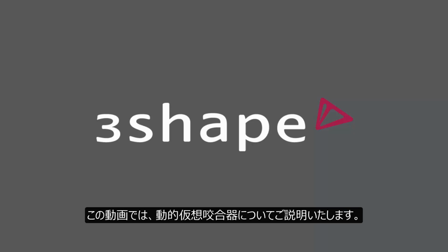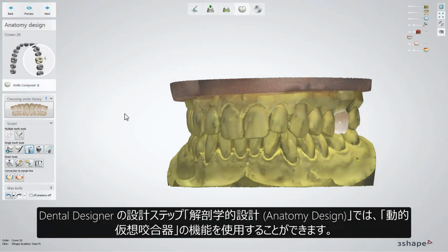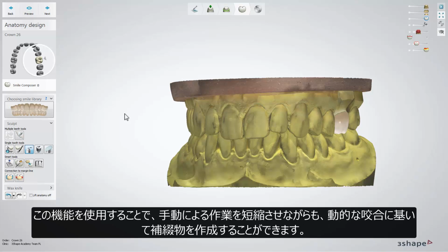Welcome to our video about dynamic virtual articulation. In the design step, called Anatomy Design, in Dental Designer, you have the possibility to use a dynamic virtual articulator. This allows restorations to be created with dynamic articulation, reducing the amount of manual work.